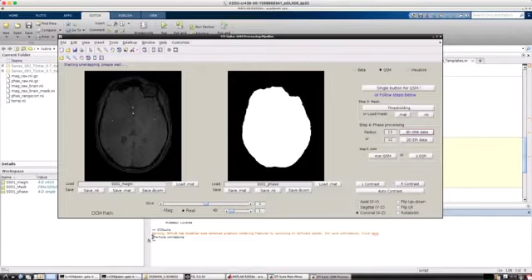It will start with phase unwrapping, as you can see here, and it will unwrap all of your echoes. So in my case I have 6 echoes, so it will start with 1 and it will finish up with 6. And this is a process that will take a little longer, perhaps 2 or 3 minutes, but we'll just wait until it finishes. You can only proceed once it says done here or something, filtering done.